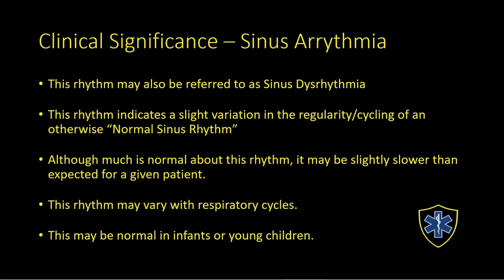If I was talking to the ER staff or calling in a report, I'd tell them to have the patient on the cardiac monitor showing a sinus arrhythmia of about 60 to 70 beats a minute, but perfusing well. This would let them know that, okay, the patient's not textbook normal, but the rhythm is not causing any problem, nor is a sign of a problem, so we can move on from there. Now let's look at another rhythm.